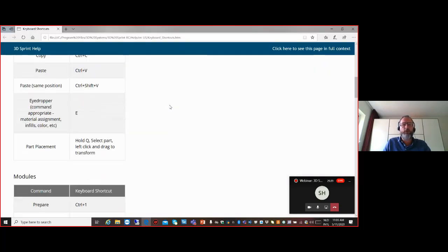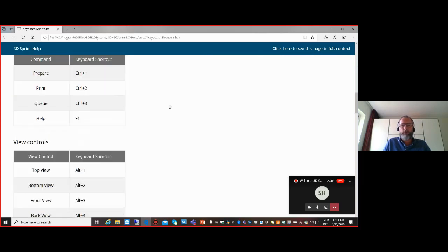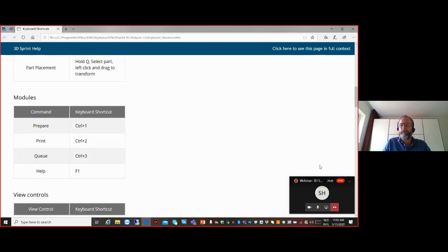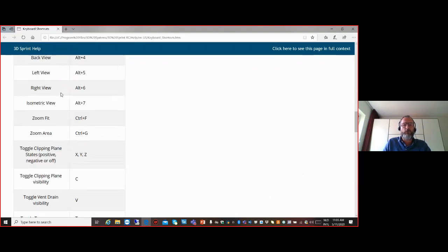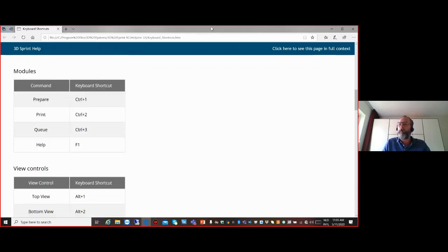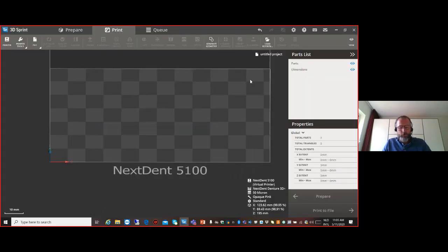Now, I'm not going to take you over all of them. I'm just going to demonstrate a couple of them. Let me remove this here. But by clicking on it, as you can see an overview of all these hotkeys. What I did personally, I just copied it and I printed it out, have it laying next to my computer so I can get familiar with it, and at some point you of course know them by heart.